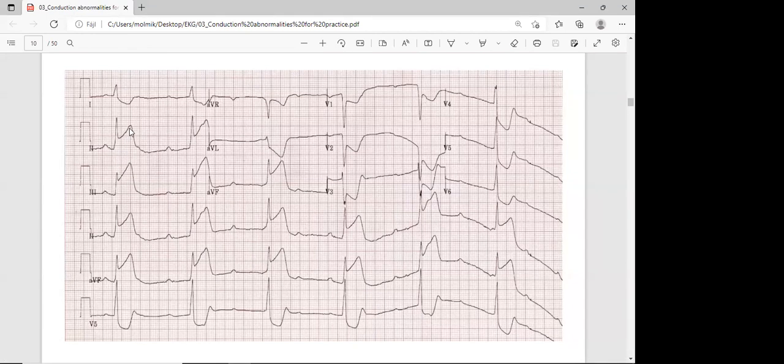Well, but we do have an ST elevation and the terminal T wave. This is for the next seminar, what we are discussing. Axis. Lead one positive, AVF is positive, that's normal. The axis could be close to lead number 2 or around 60 or so. Okay. And the QRS narrow, nothing else. Yes, that's what we have. And of course, this patient has a hyperacute inferoposterior STEMI. This is what the patient has.